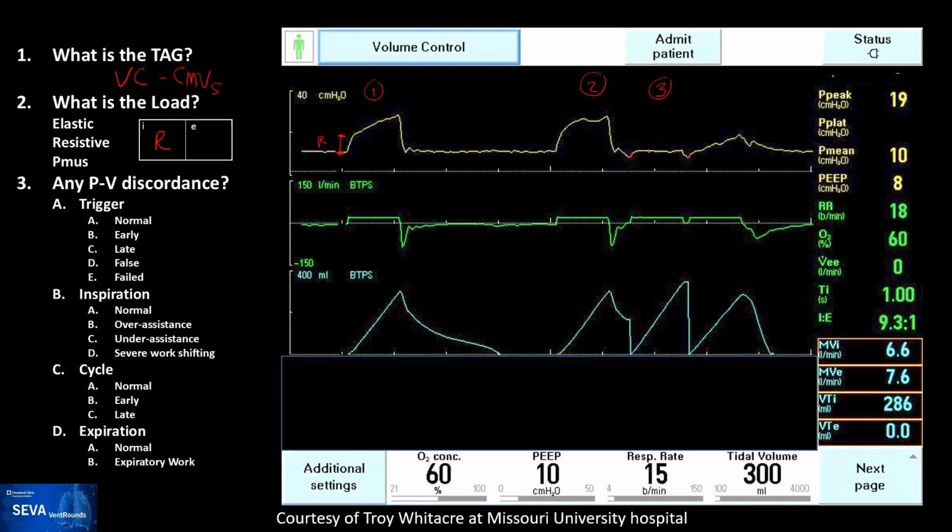And then you can see on the third breath that actually the pressure, instead of being all the way up here, is all the way down, and the breath was triggered, and we can see that there's the changing color. It's very small, but you can see it, and the same happens over here. There's triggering in both, and the pressure is much less than in this one that was passive. So that makes you think that the pressure has shifted, and this patient is doing effort in the third, at the end of the second, the third, and the fourth breath.